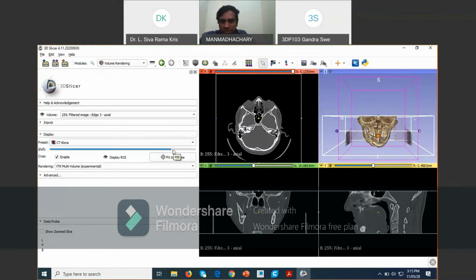Now almost all good. There are a few little errors on the outside, which I'm going to extract here. So now it's good.